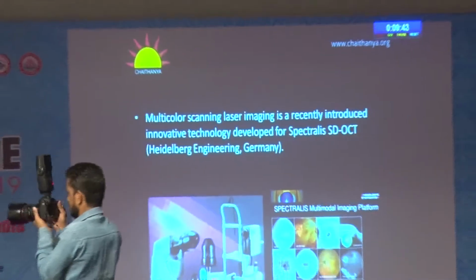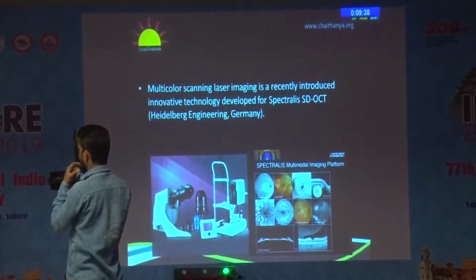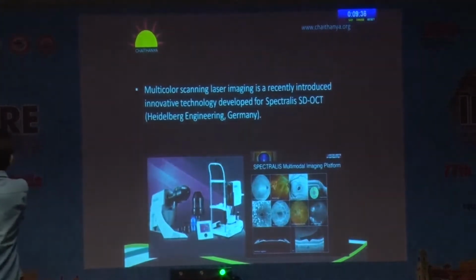So my talk will be on multicolor imaging of the fundus. Multicolor scanning laser imaging is a recently introduced innovative technology developed for Spectralis OCT, and it is fast on its way to replace the traditional flash-based fundus photography. Now it's part of the multimodal imaging platform, which is a current trend in retinal imaging.